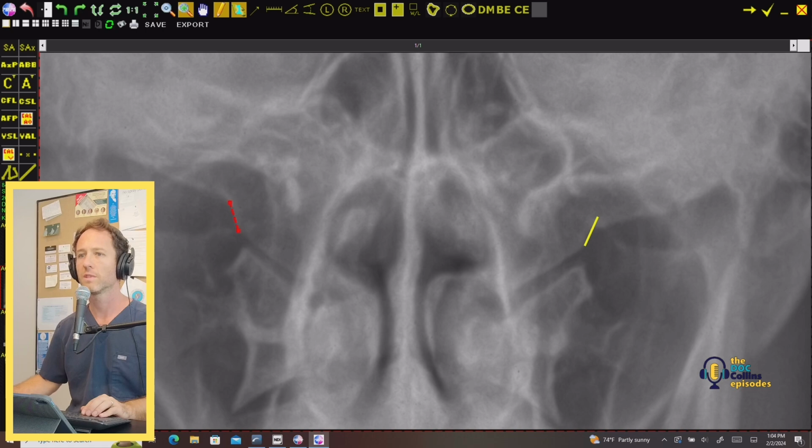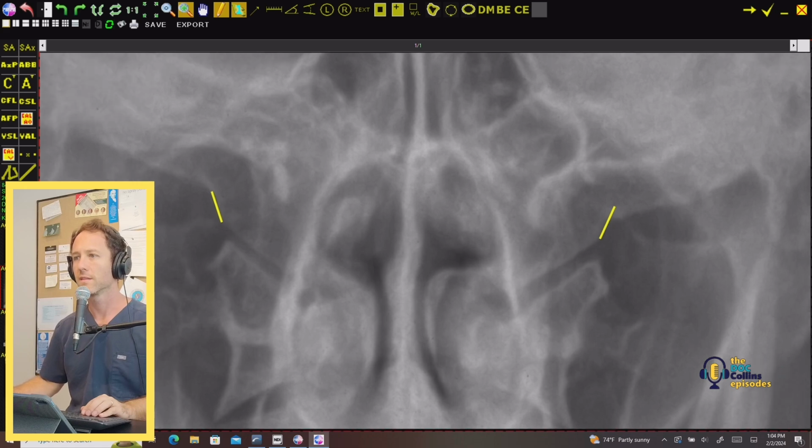But when we're talking about the condylar circle, historically, the rule was icing on the cake. So what you would do, let's just get these out of here, but you would put a dot, left and right sides, not on it, but just off of it, sort of resting on the surface.